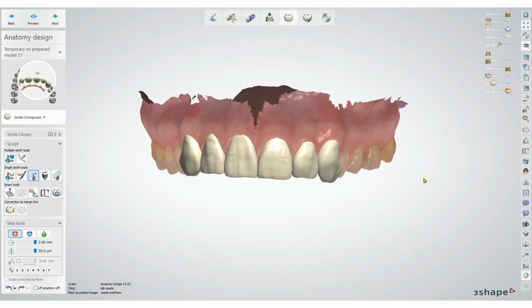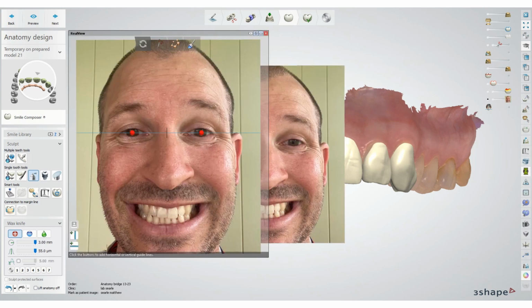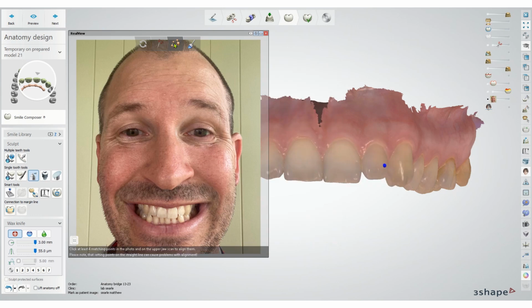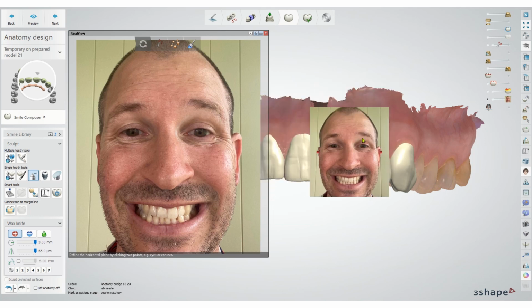And then the other question that you wanted to know about was doing the 2D real view. So we're going to click on the real view over here on the right. I'm just going to delete what I've got here, delete all lines. I'm just going to delete that line so that we're starting afresh, and let's just right click, remove all points. So we're starting afresh. Let's just move this over here.